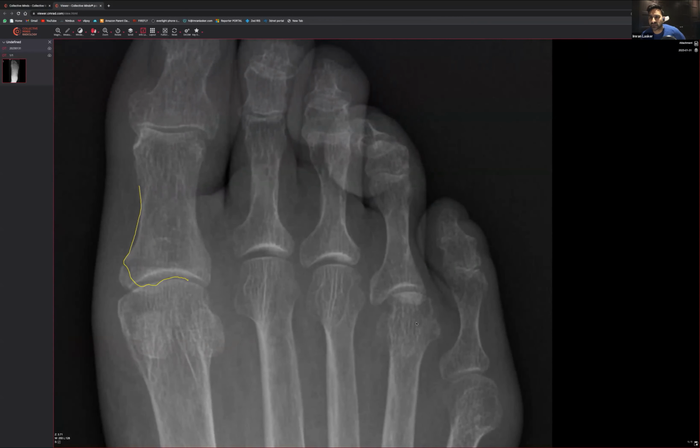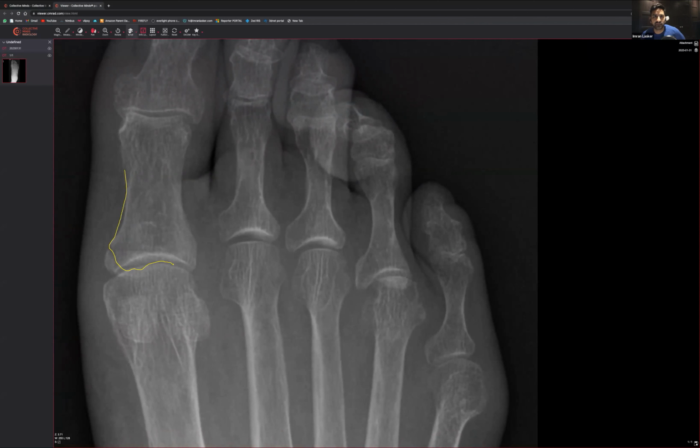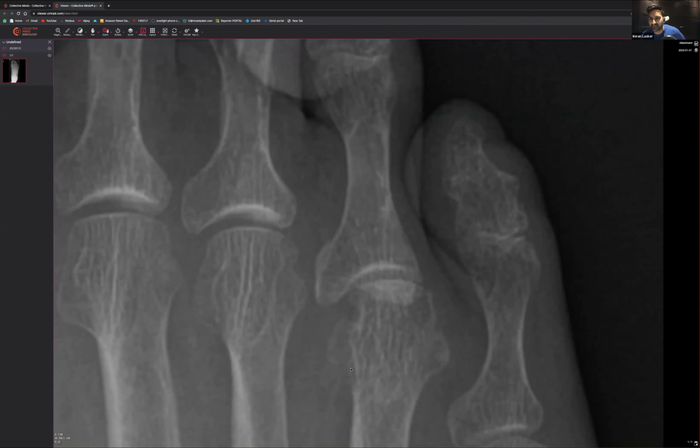Erosion of the metatarsal fourth. Okay, so 1, 2, 3, 4. Be careful. When you zoom in, you can actually see that this is very nicely rounded. You can sometimes have these little dips on either edge. So unless it's completely caved out, I'd be careful to call erosions. But I think the definites on this, especially in the context of trauma, are going to be the fractures that I talked about. How do you identify that a fracture has intra-articular surface involvement?